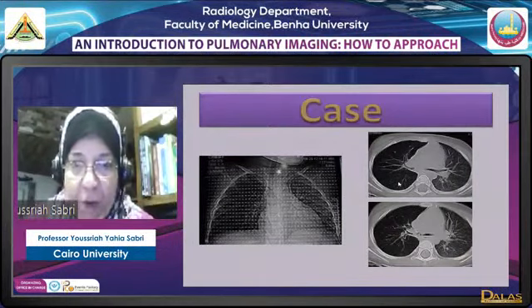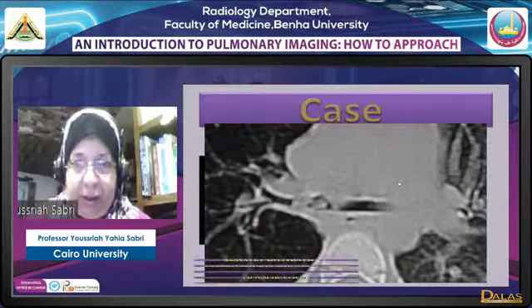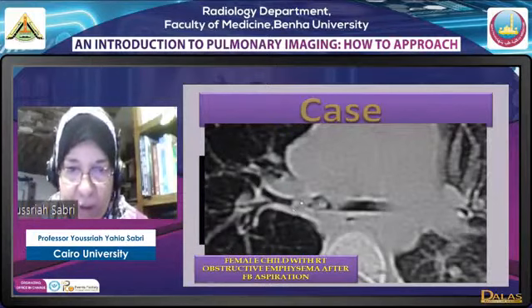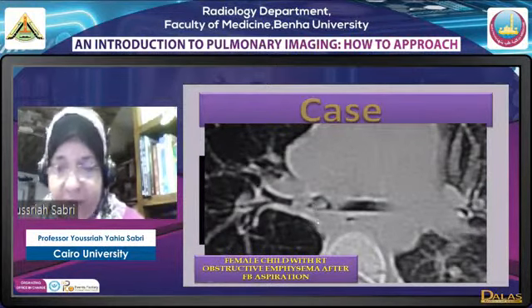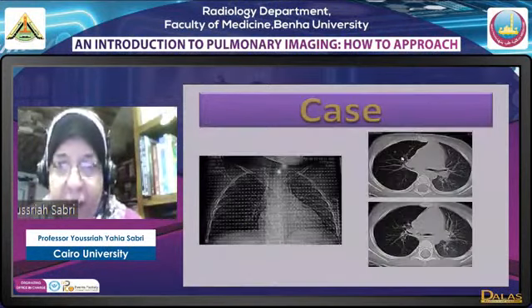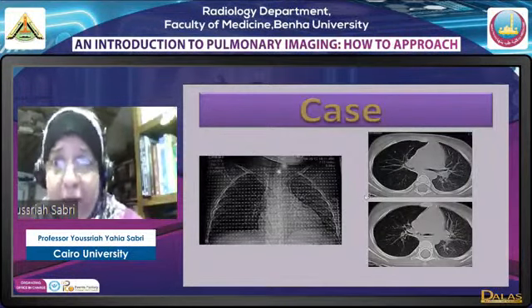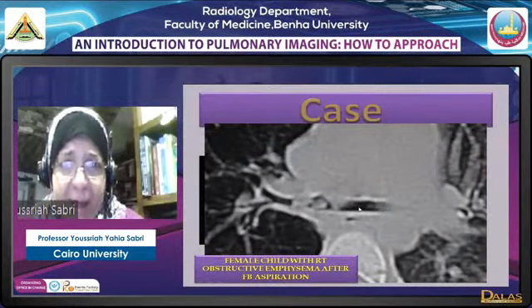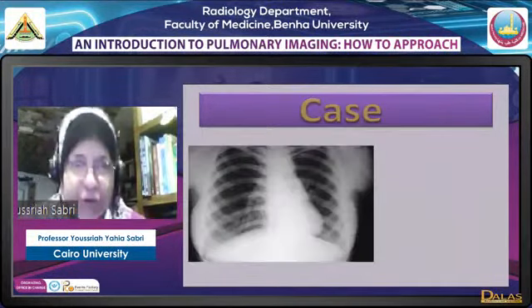We are dealing with obstructive emphysema. And in this case, we can see the peanuts. This was a female child that aspirated a foreign body, which are peanuts, and this is obstructive emphysema. This is a very serious diagnosis. In children, it could be due to foreign body. In adults, it could be the early sign of a bronchogenic carcinoma. A big black lung with no evidence of compensation.